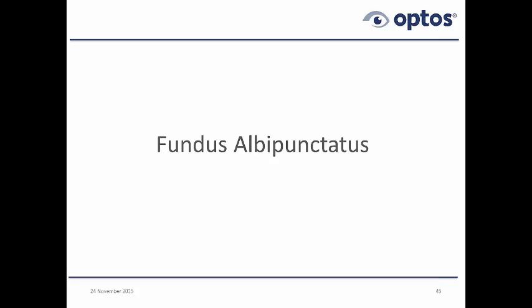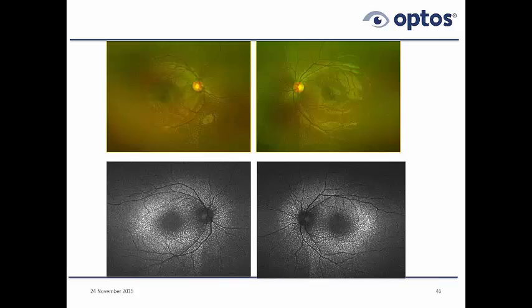Okay, let's take another condition that's not common. It doesn't quite look like drusen, but it's very, very interesting: fundus albipunctatus, which is a form of congenital stationary night blindness. We can look above in this 9-year-old and see mostly reflections off the internal limiting membrane. That's all this is in the left eye. In the right eye, these are also reflections off the internal limiting membrane. We're not seeing very much with the color images, though you could if you expanded them, blew them up a bit.